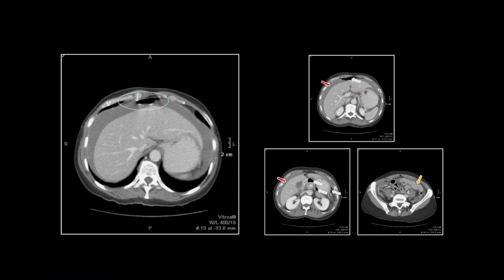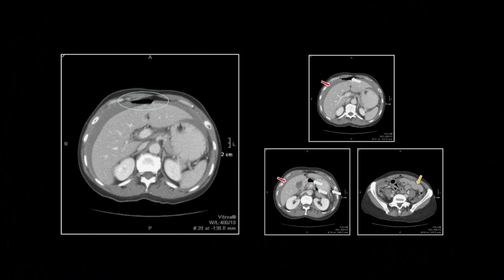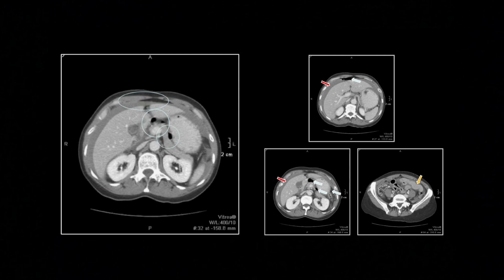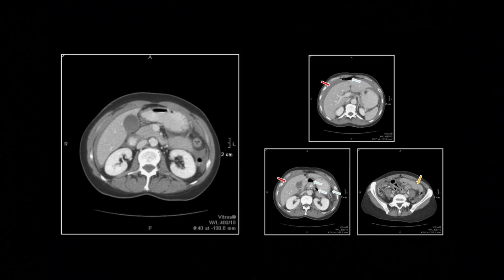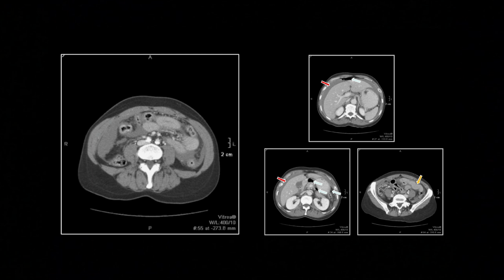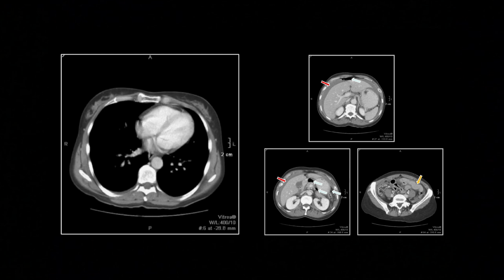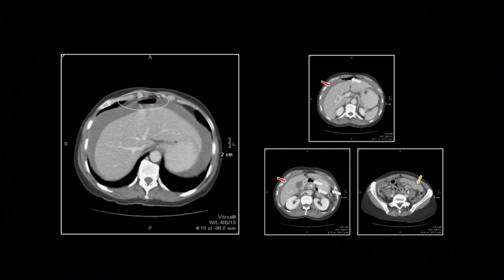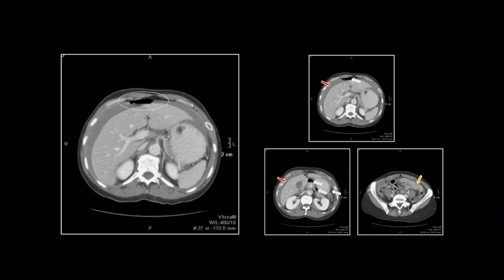All right, so here are a bunch of little lesser sac foci, see up in the portal region as well. But right there, that's the lesser sac gas. Right in front of the pancreas, right behind the stomach. And again, just like with the esophagus, you're not always going to see the focal perforation, but just the presence of gas in the lesser sac tells you this is a posterior gastric perforation.